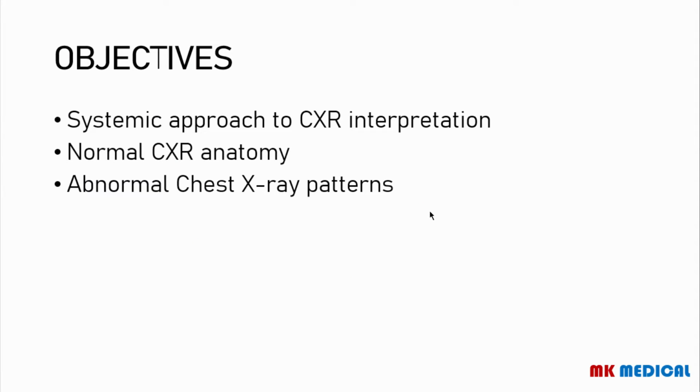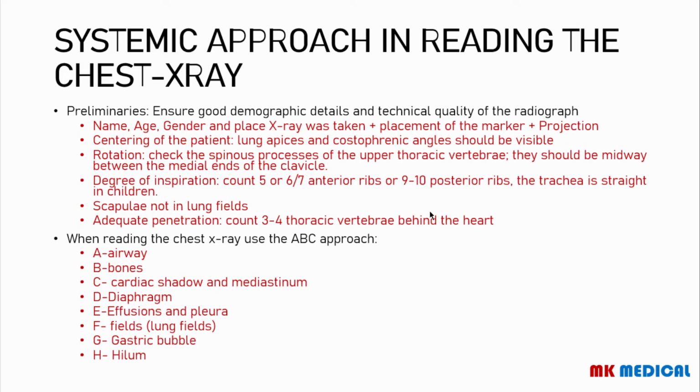Like I already said in the previous review lecture video, we covered the technical qualities of a good chest x-ray before you actually begin to read the x-ray. So in this review lecture, we shall look at a systematic approach to chest x-ray interpretation. We shall look at a normal chest x-ray and later move on to abnormal chest x-ray patterns. Remember that before you start reading your x-ray, ensure that you have good demographic details.